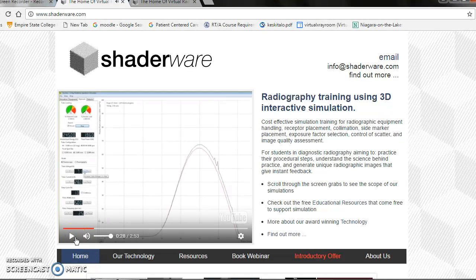Okay, so moving on from that, we also have some post-processing features right here. You can actually manipulate the window and level, and move the algorithm here to process the way that you want. As you window and level the X-ray image, you can actually see how the histogram changes, and the way the curve changes as well.